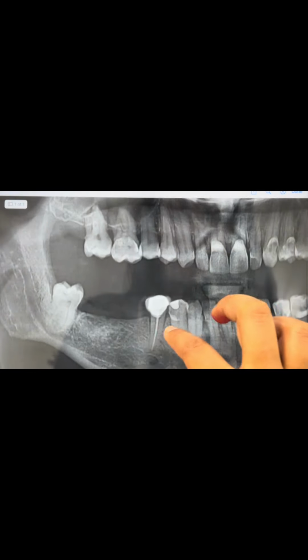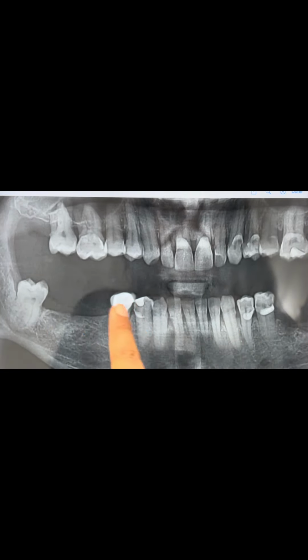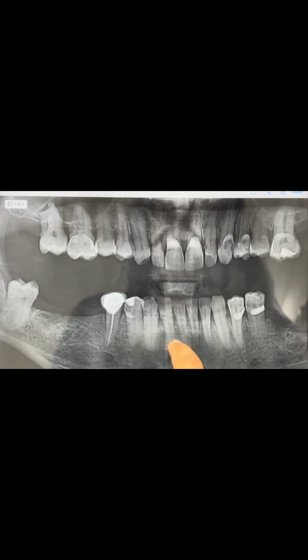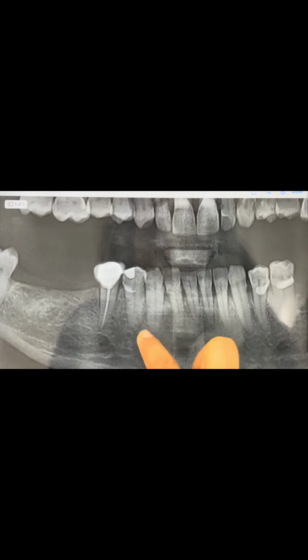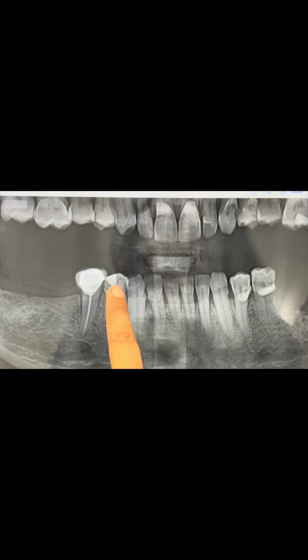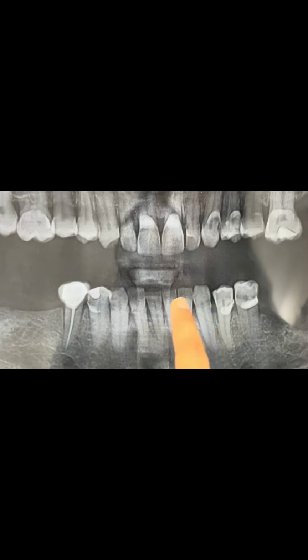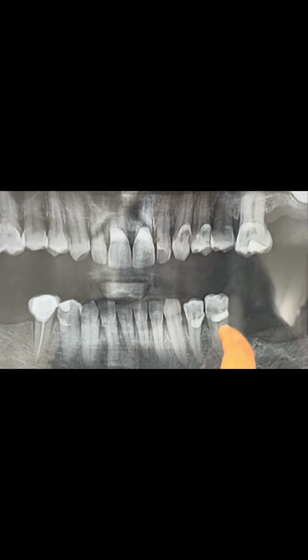Next up, moving to the center, we can see a few dental treatments that have been done. Posterior molars are missing on the right side. This is a crown. Then there is a root canal treatment that has been done. After this, we can see an old restoration over here and also on these two teeth. These are cervical restorations.